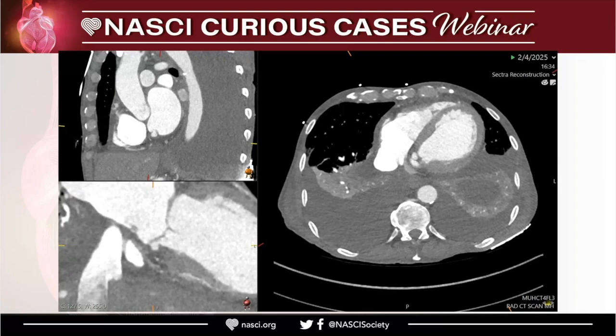To my understanding, when you have an outpouching of contrast, that's a pseudoaneurysm. Is there an abscess or not? Whenever you see a hypoattenuated area associated, usually we say abscess. But if you do not see that and you do not know if the patient has infection or not, then probably I'd call it pseudoaneurysm. What do you guys think? We have many other experts here. No, I agree. I think it's a spectrum of the same process.